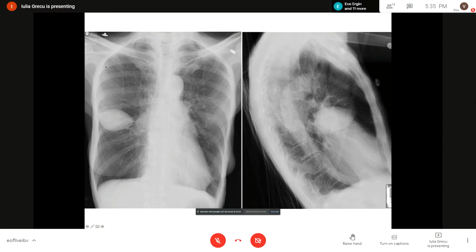You will see in a minute. So loculated pleural effusion, in this case, along the horizontal fissure. So it's not quite in the middle lobe of the right lung. It is along the fissure. It is a pleural opacity, not a parenchymal or intrapulmonary lung opacity.